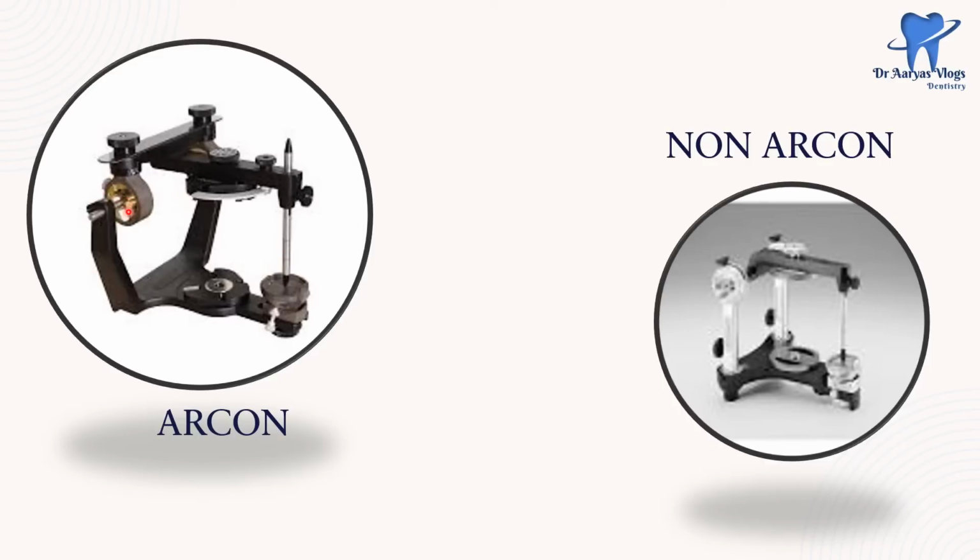So here in this picture, this is the condylar element, and see, this is present in the lower member of the articulator, and this is the upper member, and here this is the condylar element. See, this is in the upper member of the articulator. Okay, so condylar element in the lower member, that is arc-on. Condylar element in the upper member, it is non-arc-on. Simple. Okay. It can be memorized, as arc-on can be split into arc and con. So con is in the lower member, that is condylar element in the lower member, it is arc-on type. Condylar element in the upper member, it is non-arc-on type. Simple. Okay.